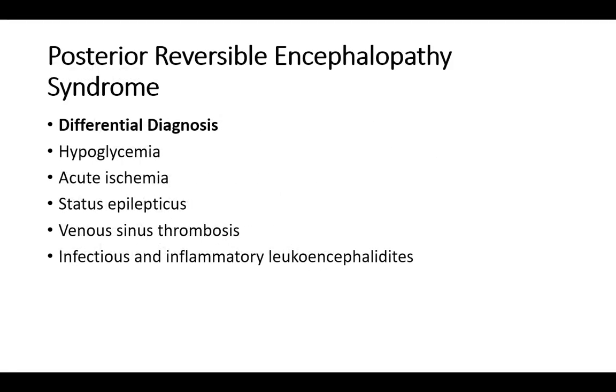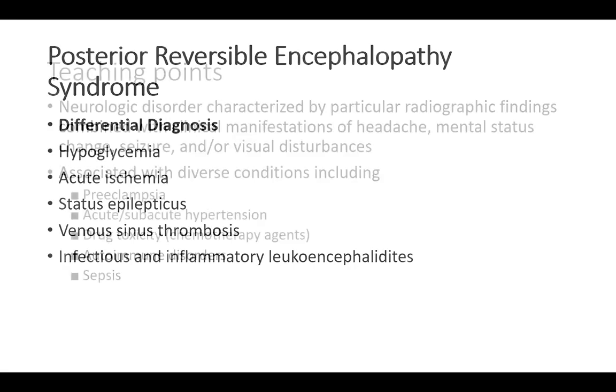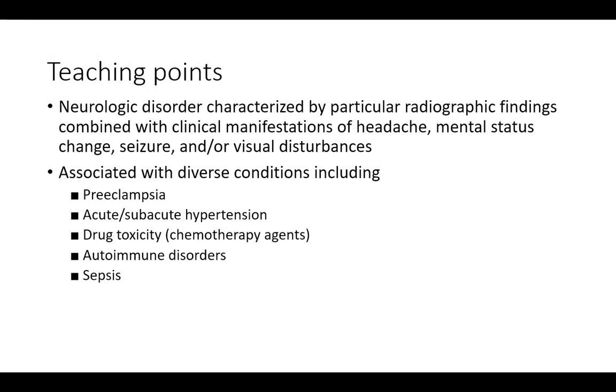This is a case of PRES, or Posterior Reversible Encephalopathy Syndrome, and there is a differential diagnosis for these cases, listed as follows. Some teaching points on PRES.